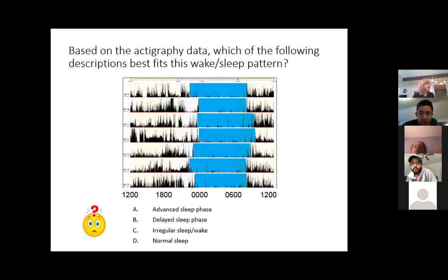You'd say take it off. But I just want you to be able to pattern recognize. But see that? Very flat, nothing going on. It was off. Device was off. They're supposed to tell you that on your log, but they don't always give you the log.